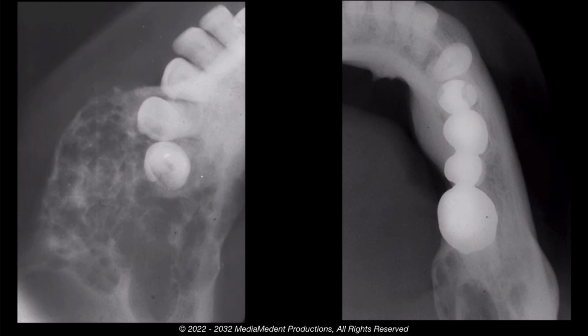It is important to remember that the multilocular appearance is not unique to any radiolucent lesion. In one patient, a lesion described as having a multilocular appearance may present in another as having a unilocular appearance. Factors such as anatomic location and maturity of the lesion may have an effect on its appearance.